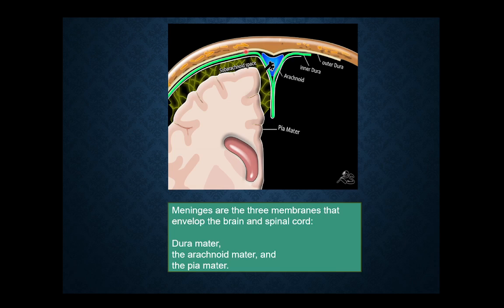If the hematoma is above the dura, limited by the bone, this is epidural. Its significance is that it is because of a tear of the branches of the middle meningeal artery. If it's subdural, it is because of the bridging veins. The importance of subarachnoid is that it extends into the sulci and causes obstruction to the flow of CSF.